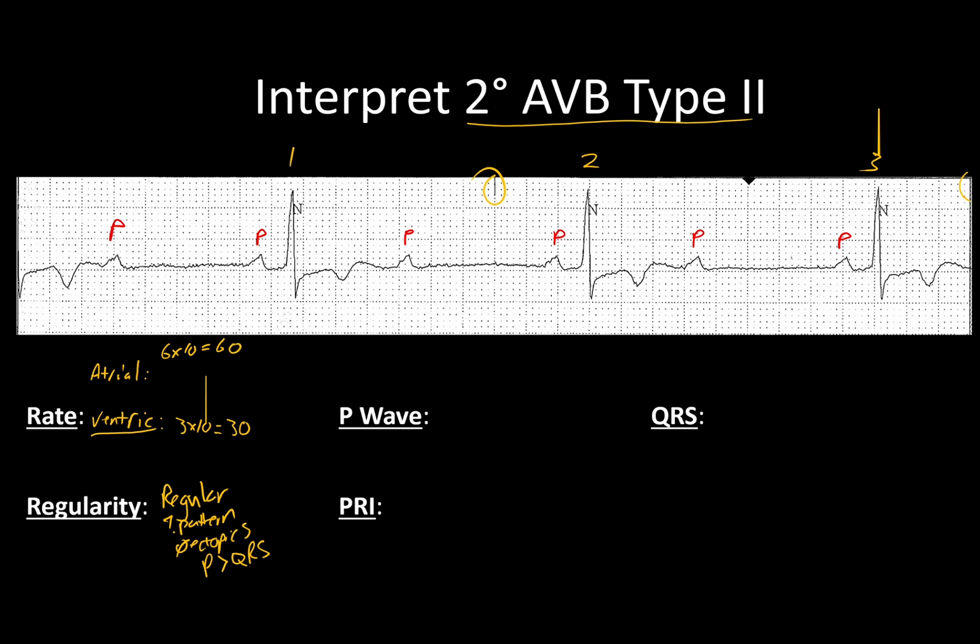And what is our distance between them? I'm going to switch back to red since we're specifically doing P waves. I'll do these way low here and probably about right here. That distance there is 23. The next P wave starts probably about right in the middle of here. That one comes out to be 24.